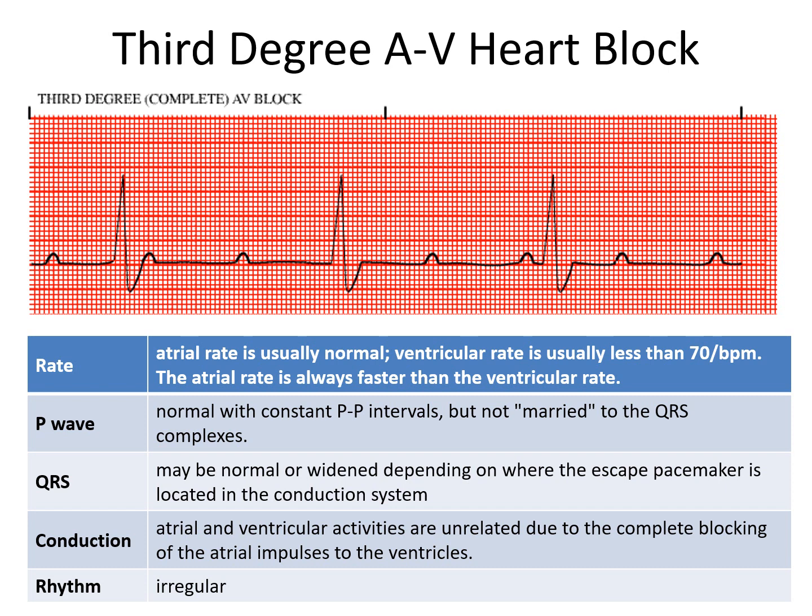I'll say that one person in the couple is coming and going as they want. They're just living their life like they always have. That's what you can think about as the P wave. The P wave is just firing impulses, just doing its own thing, and the ventricles, the ventricular contractions, are doing their own thing. They're not listening to this one, and the impulse is not coming through and telling it to contract. It's contracting whenever it wants to. Now, same here. The ventricle contracted whenever it wanted to. It had nothing to do with the impulse that came from this one because they aren't speaking to each other. It just happened to land near this P wave on the tracing. Okay, so they're completely independent. They're each doing their own thing, but they're still residing in the same house. They are not communicating with each other.